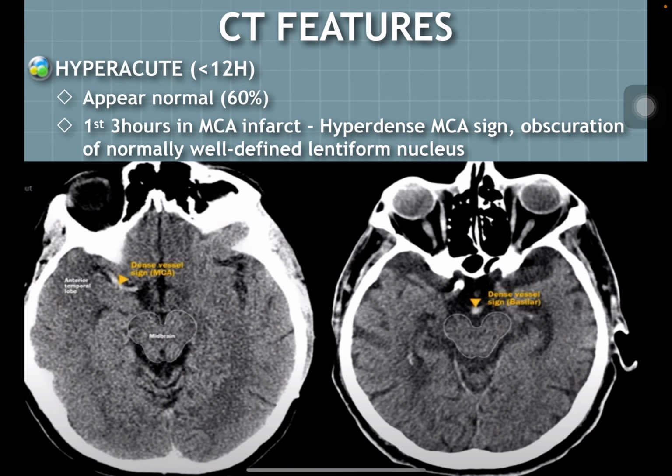Here, let's identify the abnormal hyperdensity on these two scans from two different patients. The image on the left shows a serpentine hyperdensity outside of the brain in the Sylvian fissure. What lives in the Sylvian fissure? It's the middle cerebral artery.